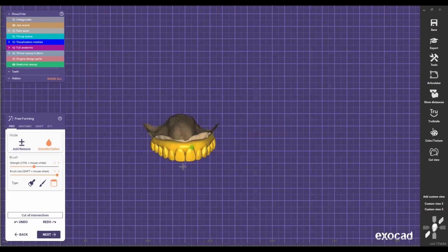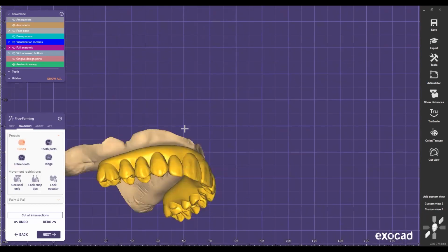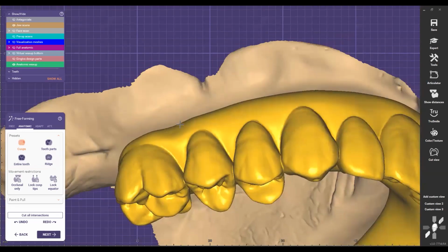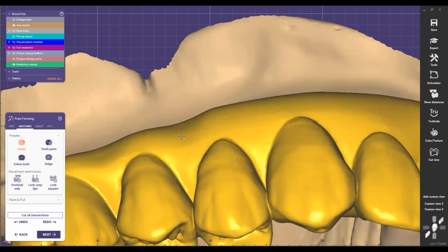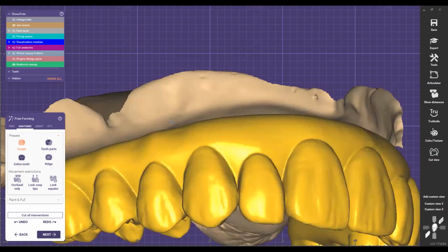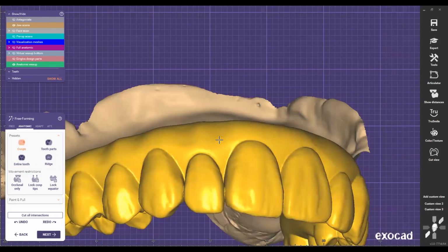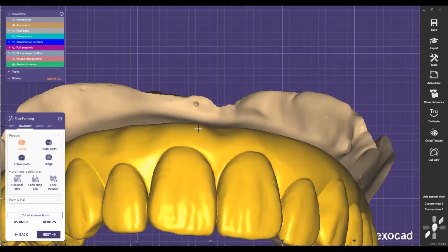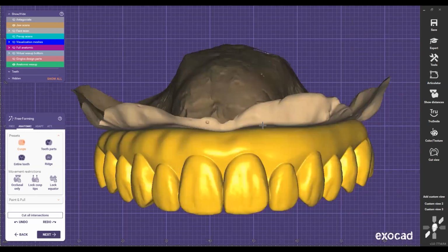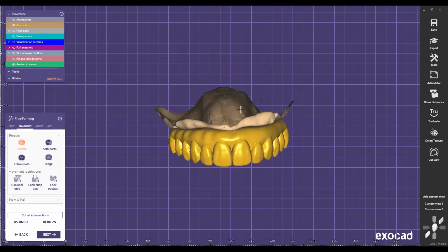Here, I try not to spend too much time on the tissue. But if you want to, you can start making the shapes right here of the roots. Start pushing this in, just trying to create roots of this one. But remember, when we bring the tissue from surgery, we might change this information. So that's why I would just try to leave it more generic like this, and then later I just modify it. But that's up to you. My recommendation will be that.